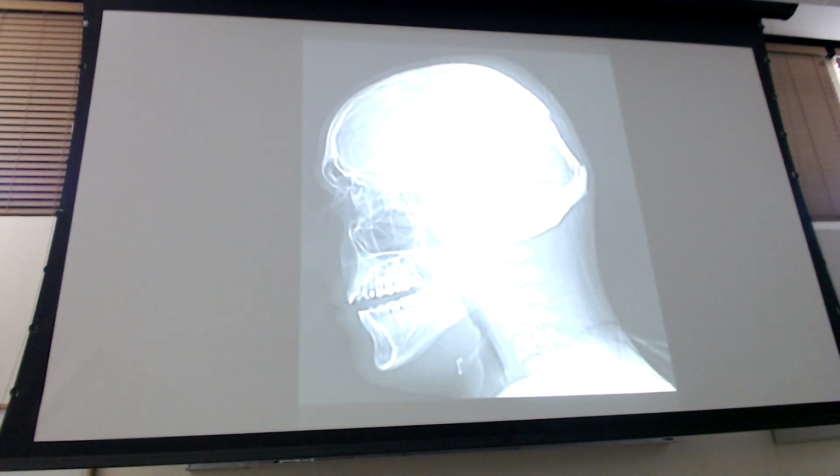What do we got here? Say it again. Depression fracture. Not to be confused with compression fracture, which is for the vertebrae. Right? Depression fracture, right here. The skull was depressed. Not sad, it got depressed.